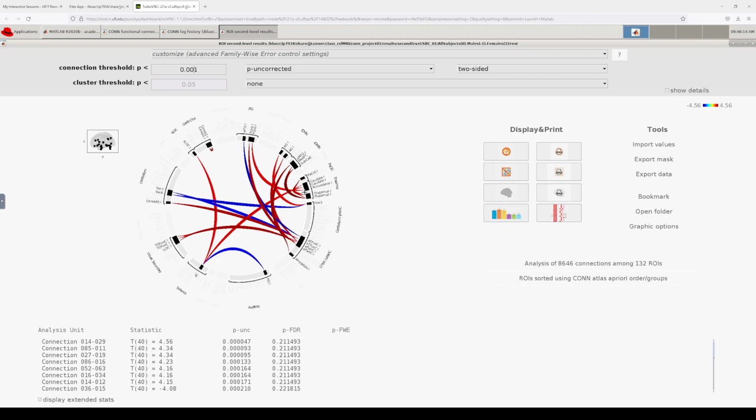But again, if these were clinical groups, we had individuals who had traumatic brain injury versus not, and they're matched in all of these other variables. Are there differences? And if there are differences in connectivity, is it good or bad? It depends. And just because there's a group difference doesn't mean we can always interpret one as superior, inferior, or better or worse. We might be able to, but again, something to keep in mind. But potential differences, so you could screenshot this, do a 3D brain, screenshot that.